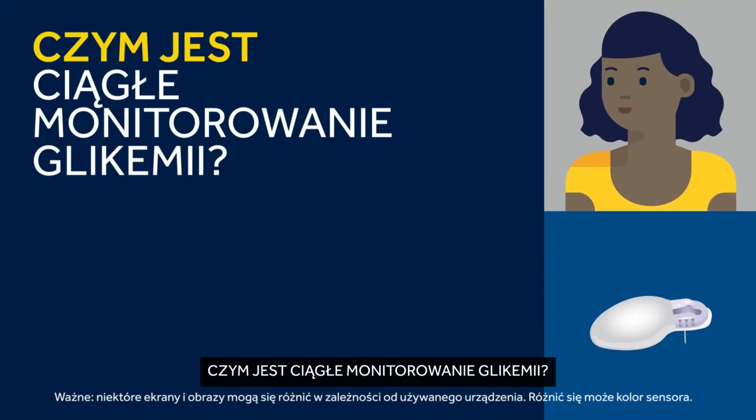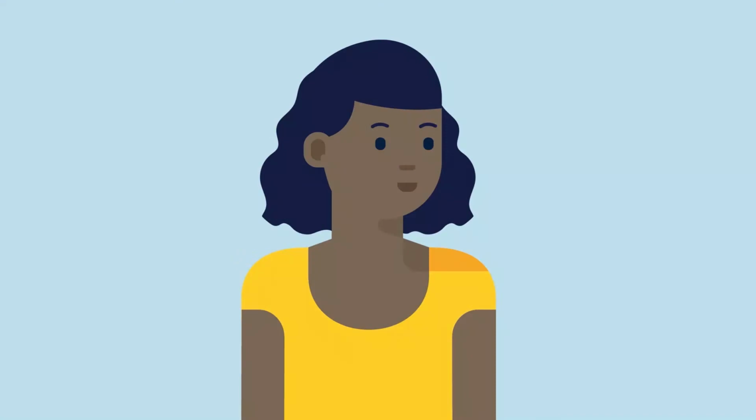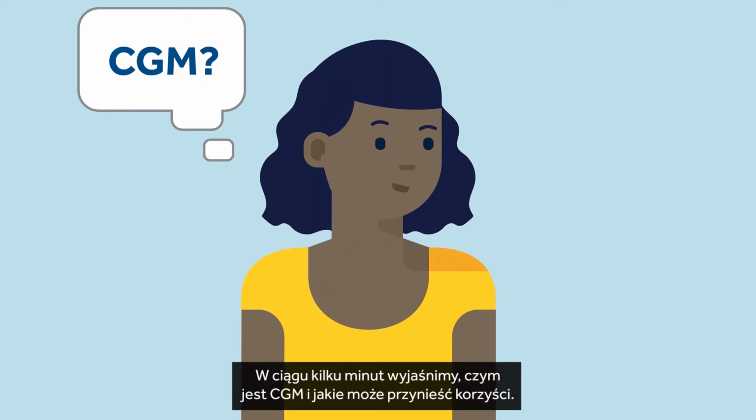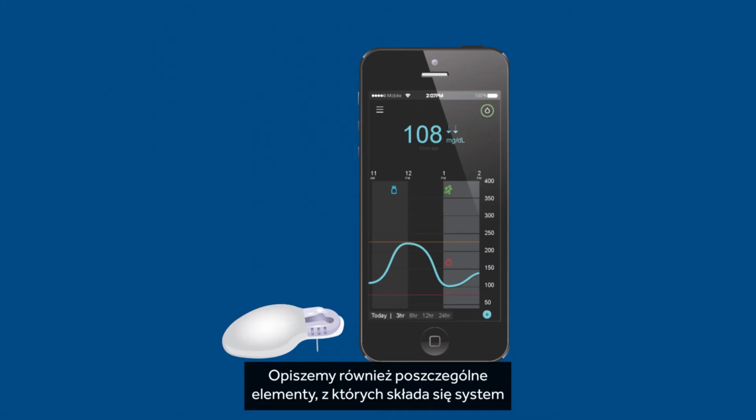What is continuous glucose monitoring? You may be wondering, what is continuous glucose monitoring, or CGM? In the next couple of minutes, we will explain what CGM is and what it can do for you. We will also introduce you to the various parts of the system and let you know what you can expect when using CGM.